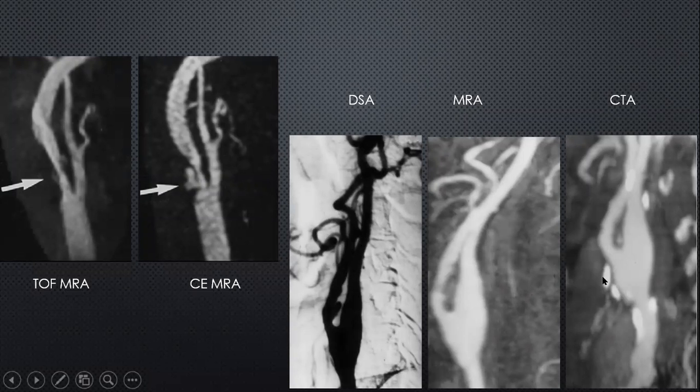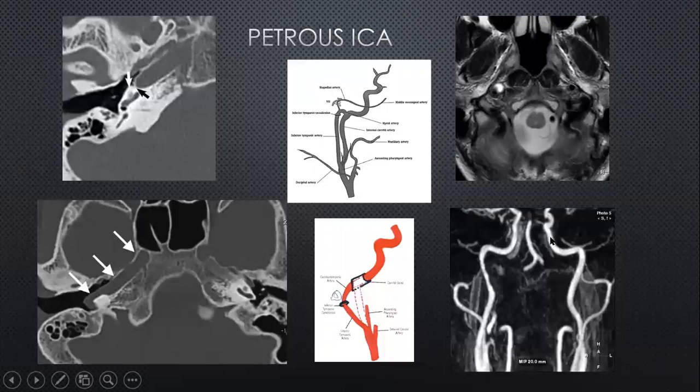One of the problems with Dopplers, of course, is that if there is extensive calcification, for example, as in the CTA, these plaques will prevent adequate visualization of the carotid artery and the lumen, and hence a CTA or an MRA can be more useful in those circumstances. Certainly, if a patient is being worked up for endarterectomy, it's not unusual to have a supplementary examination, either an MRA or a CTA, apart from the Doppler itself.